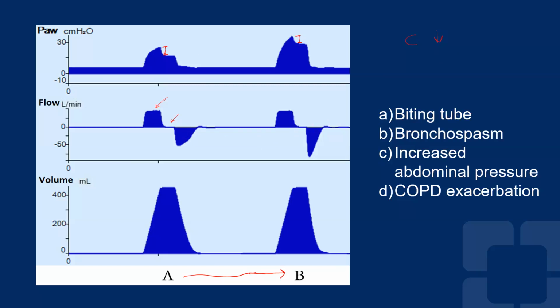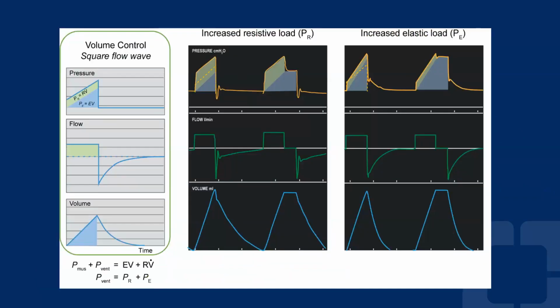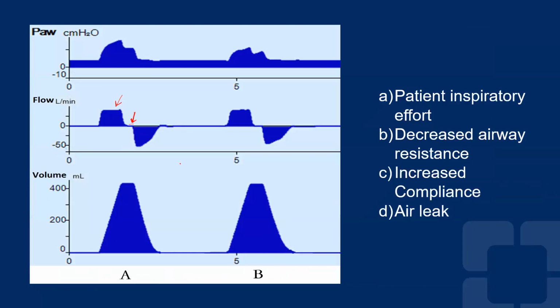And you can see here a relationship in which, as the pressure from the patient, the effort, starts increasing, the ventilator delivers less and less support. The classic relationship for this is present on volume control, meaning you're controlling the flow. So as the patient generates more pmus, the ventilator will require less pressure to deliver the same volume. The same happens on the adaptive targeting schemes, which are PRVC and volume support. So what you see here is a drop in the pressure from one to the other.